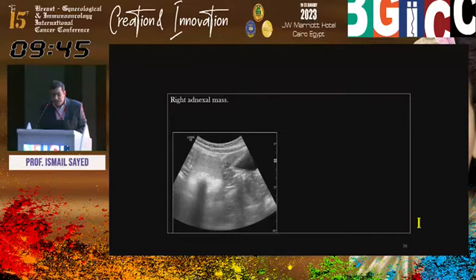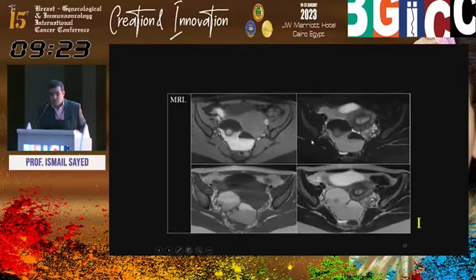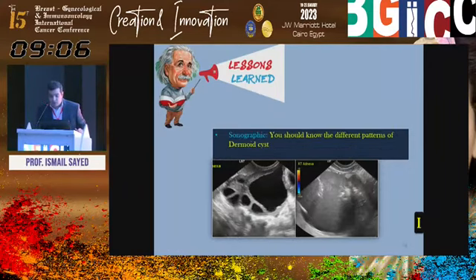Okay, the measurement now is about 6 or 5 centimeters. Oh, that's 2. But now it's elongated, bilocular. Now the size is more than 11 or 12, another category. So get the maximum length of this lesion to put it in the appropriate O-RADS category. It's bilocular with a fluid level, and of course the classic MR criteria with drop of signal in fatty tissue. So this is a dermoid cyst incidentally found during fertility treatment or folliculometry.